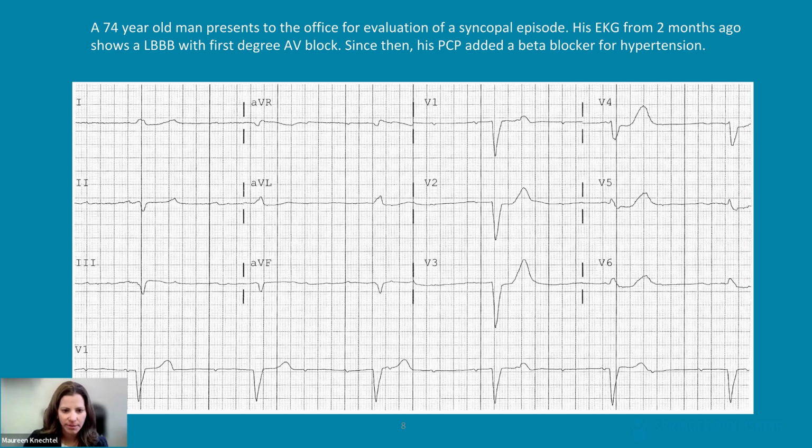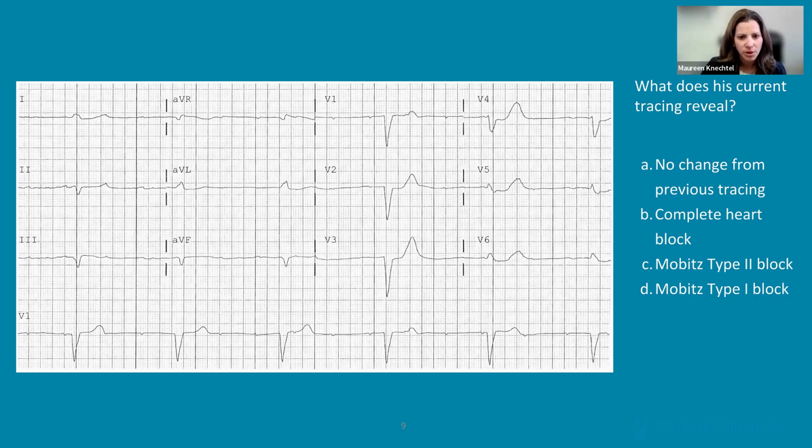You'll still have a chance to think about the tracing some more, but we'll go ahead and pair that with a multiple choice question. We're asking simply, what does the current tracing reveal? What is your interpretation? Someone hands you this EKG, what would you say?